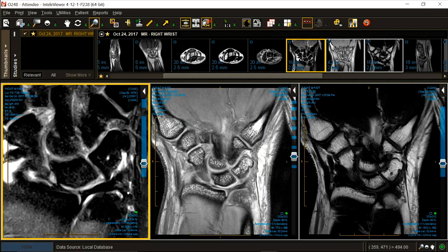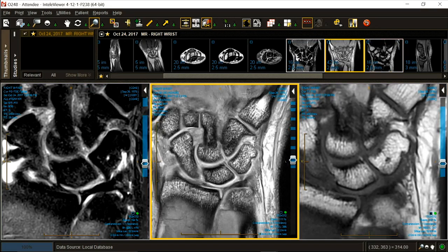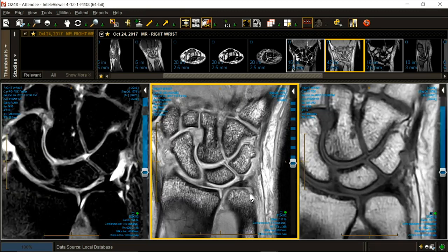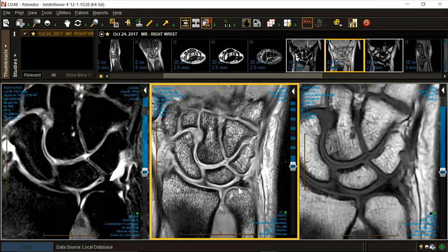Okay. Patient's 31, I believe. 39, sorry. LT ligament, cartilage, cartilage, cartilage, signal, gradient echo, ill-defined, central, not vertical, not bright, not complex, normal. Let's keep looking, shall we?